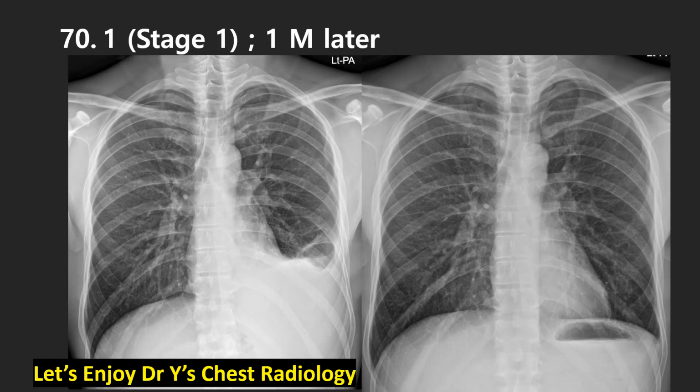What happened to him 1 month later? On the right side, we see an almost normal, clear, healthy chest X-ray of him. He was cured, reversed after adequate antibiotics treatment, ASAP, as soon as possible. He was successful.